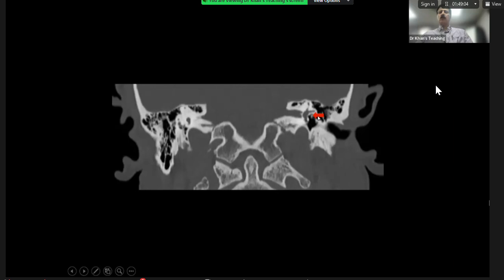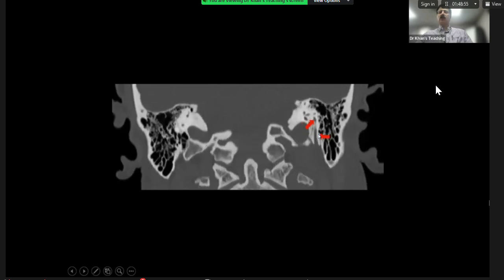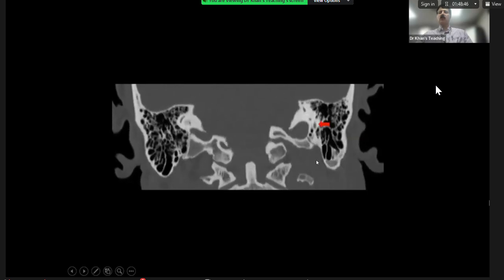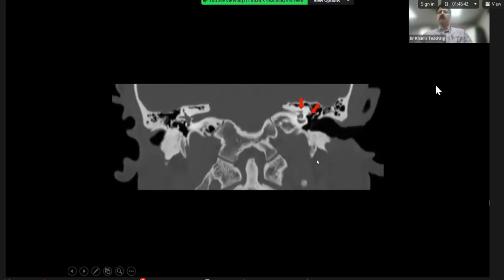Now this is the tympanic portion, and we are going posteriorly, and we are expecting it to dip down vertically, and on a coronal you will see it very well. You see this thing? It goes vertically down like this, and you can imagine that this is the stylomastoid foramen, and here will be the parotid gland. Now if you see the relationships, here is the epitympanum, this is the scutum, this is the external auditory canal.